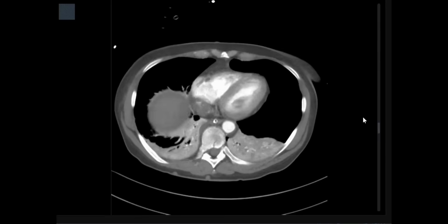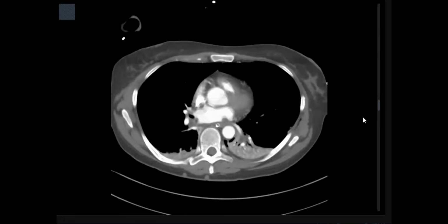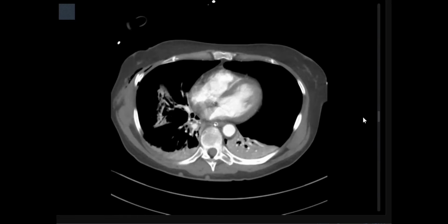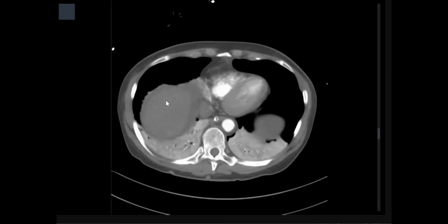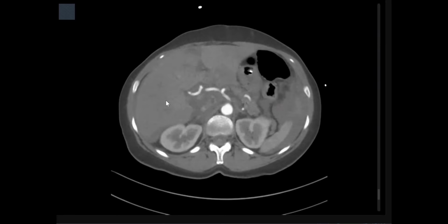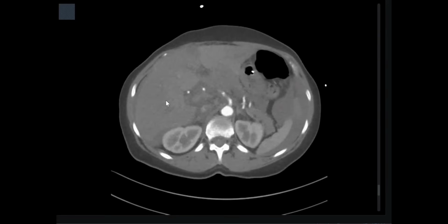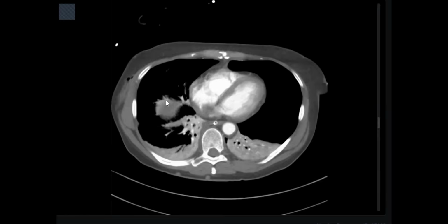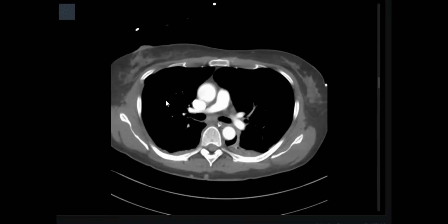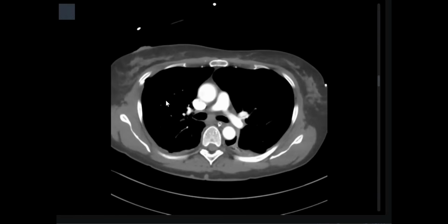There is some surgical emphysema on the anterior chest wall on the right side, and therefore I'm suspecting there is rib fractures, and I think there is a rib fracture that I can see here. Now I would like to examine this further on a bone window. There are also several rib fractures on the left side that I can appreciate as I'm scrolling, and surgical emphysema on the left side as well. So we have bilateral rib fractures, bilateral basal lung consolidation. No definite pneumothorax or pneumomediastinum in this window.